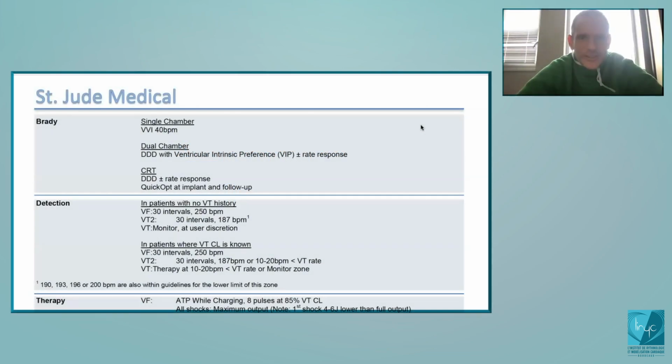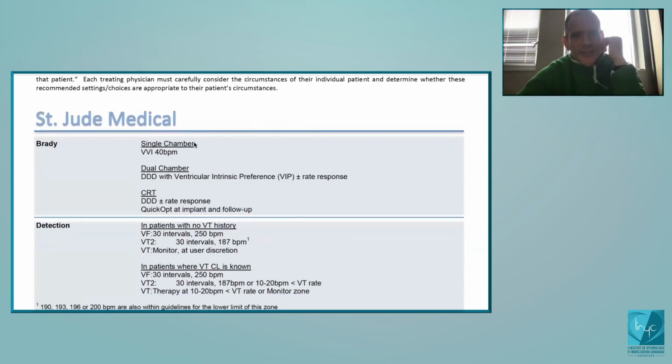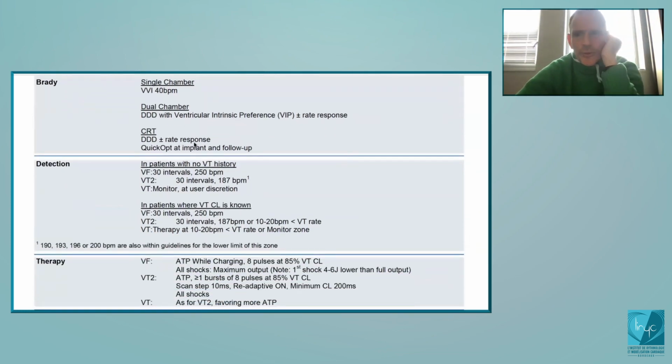Today we're going to discuss how to program and interrogate Abbott ICDs. So, the guidelines for St. Jude Medical Abbott: if I had to summarize, you see here the advice for programming in primary prevention, so patients with no VT history.